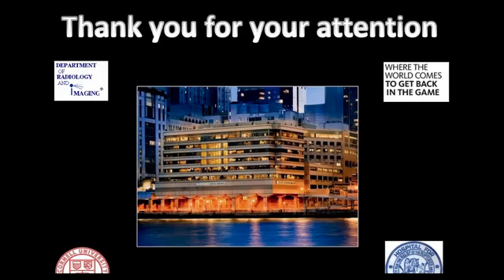Next is, why can vacuum phenomena be bright? The paper was by Mark Schweitzer a number of years ago, and I think they hypothesized that sometimes when you lay down, you can draw fluid in the disc, and that's why it looks bright. Or it just for some reason creates this bright signal on MRI. Bright on T2. I mean, sometimes it does look dark. Sometimes it looks like gas or air in there, but I don't know the real answer to that. But I do know that it does happen.